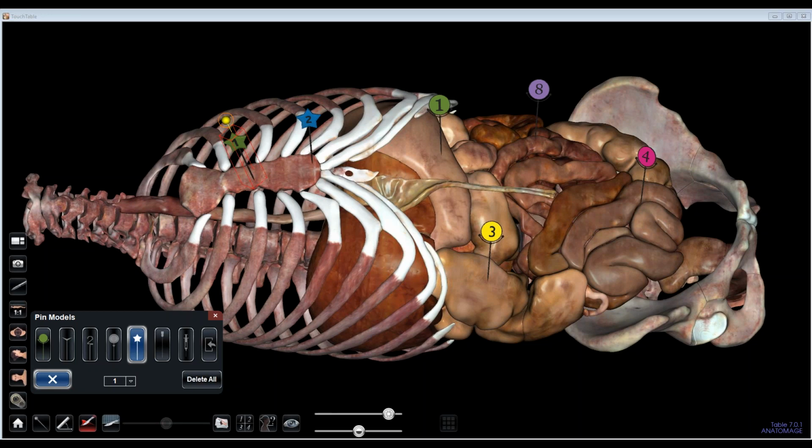You can either set up multiple presets, or you can place 2 different pins, name the circle pin, name the star pin, etc. Maybe a specific lab group gets a specific pin style that they have to answer. So there's some options there that you can certainly work with.